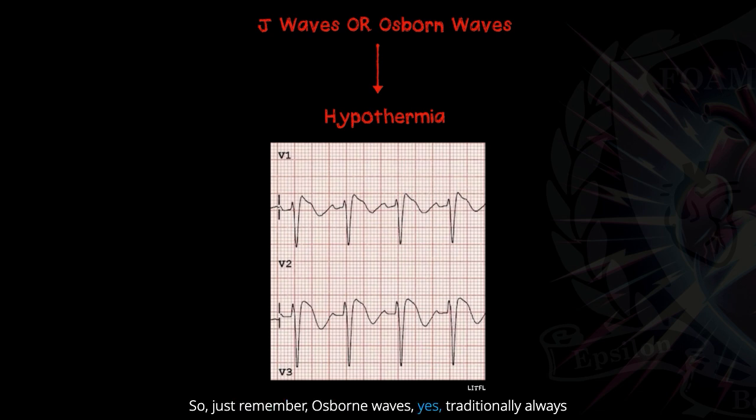So just remember, Osborne waves, yes, are traditionally thought to be present with hypothermia. They get worse and more pronounced as the temperature drops lower and lower, but there are other situations that we need to look out for that look similar to this.